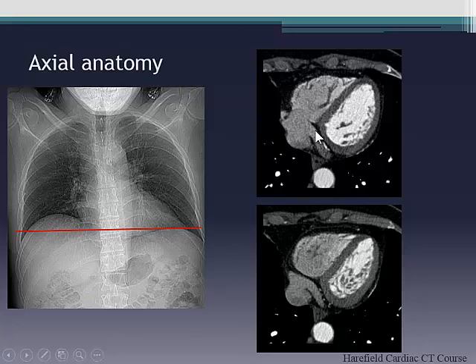One of the things that you should be alert to, and one of the things you should do when you're doing coronary anatomy, is get used to reconstructing all the standard planes. There are two advantages to that. One is obviously it gives you a second chance to see something that you may have missed just by scrolling and looking at the coronaries.